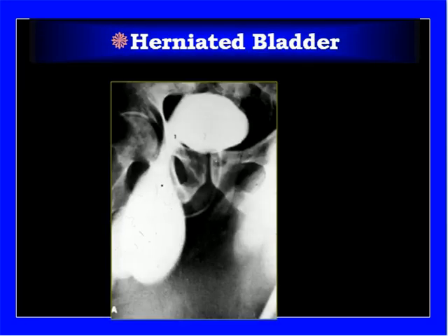In the previous section, part 2, we did see the herniation of the ureter, and now in this condition we can see the herniated bladder, which is going through a small opening down into the interior part of the thigh. The contrast filled bladder, you can see as a white shadow on your screen.